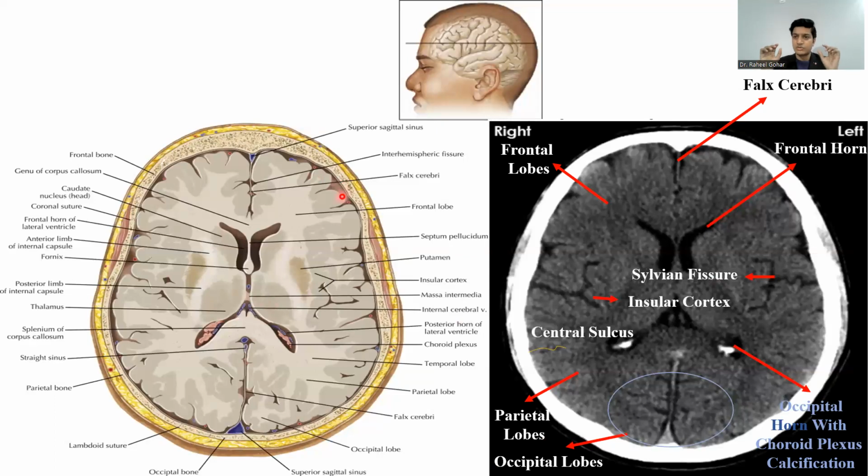Now the neuron basically has three parts: cell bodies, axons and dendrites. Forget about the dendrites. So we have the cell body and the axon. The cell bodies form the cerebral cortex and the axons form the white matter. So this structure here is the cerebral cortex, containing the neuronal cell bodies, and this white structure is the axons.